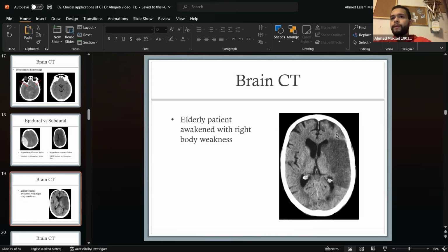This is an infarct. And I'm going to tell you how to differentiate between ischemia and an infarct in a bit. This is probably not acute because you can see it on CT. Usually you won't be able to see it on CT if it happened like an hour ago or 30 minutes ago. Middle cerebral, not middle meningeal.